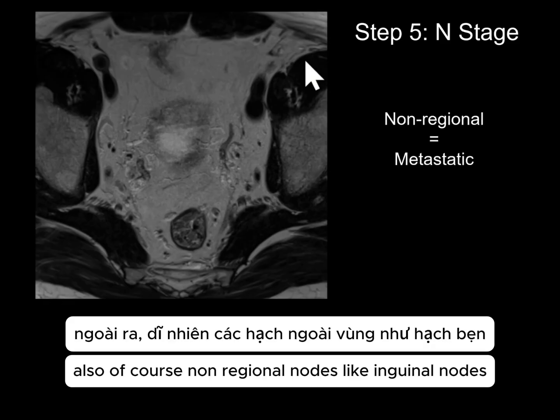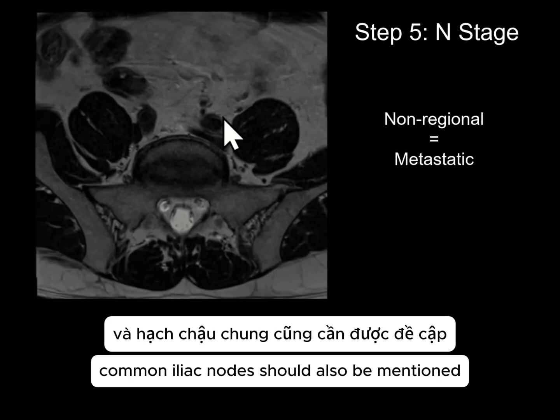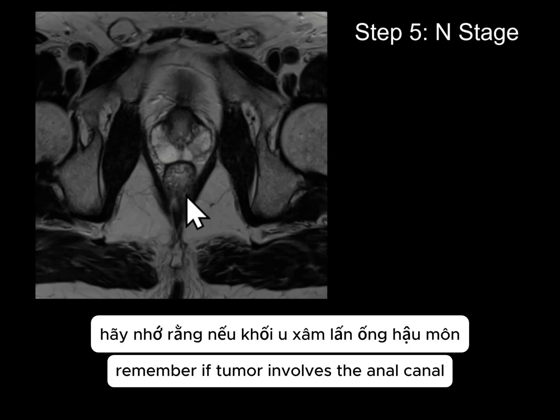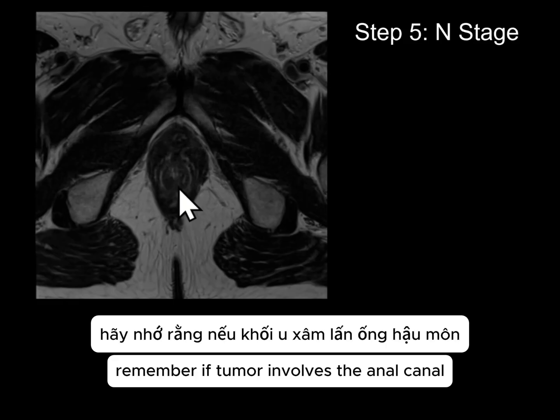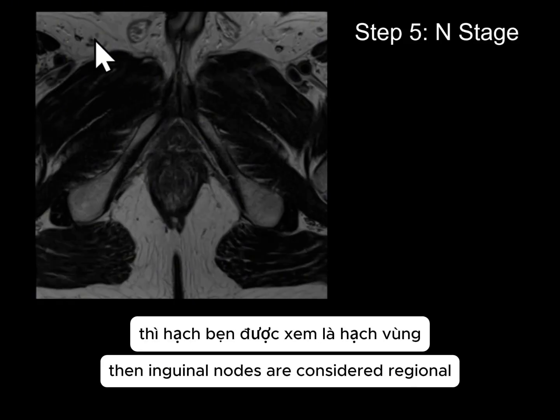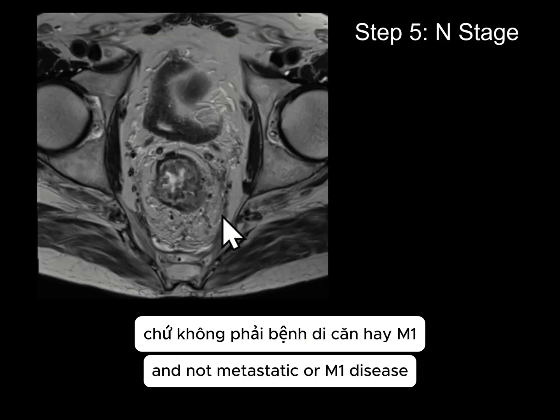Also, of course, non-regional nodes like inguinal nodes, external iliac nodes, common iliac nodes should also be mentioned. And again, those are considered M1 disease or metastatic. Remember, if tumor involves the anal canal below the level of the dentate line, then inguinal nodes are considered regional and not metastatic or M1 disease.